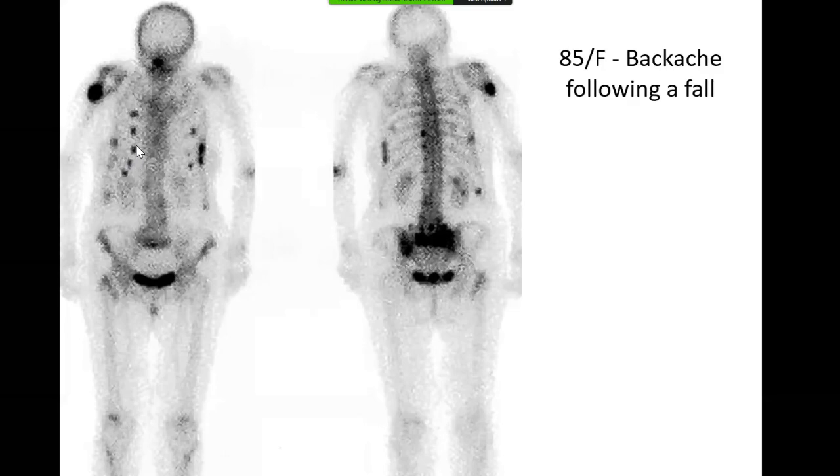There are two significant abnormalities that you missed, actually. You said that the bladder is not visible. The bladder is visible, and this is the bladder here. So again, that spectrum of normality becomes very important.